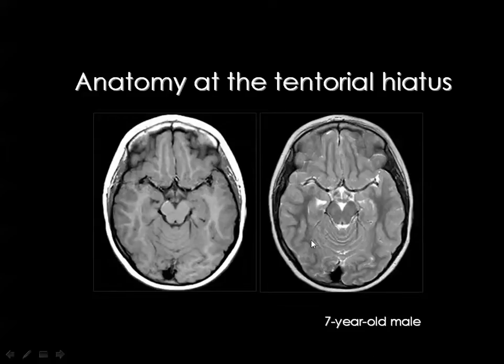of the midbrain. This is the midbrain, as you see, and this dot represents the aqueduct of Sylvius. You know that the aqueduct of Sylvius connects the end of the fourth ventricle to the third ventricle. Then this is the aqueduct of Sylvius, and this is the midbrain. And the anterior part of the midbrain here is known as the cerebral peduncle. And you have three cerebellar peduncles and one cerebral peduncle. This is the cerebral peduncle.